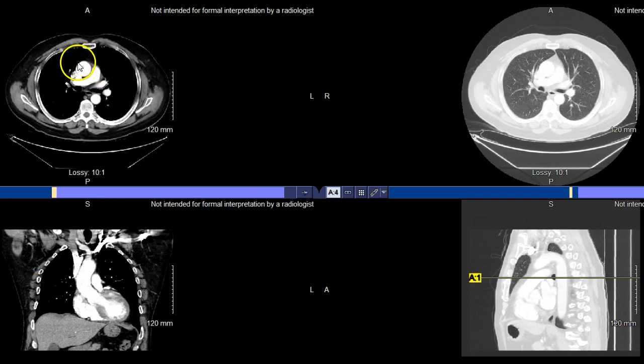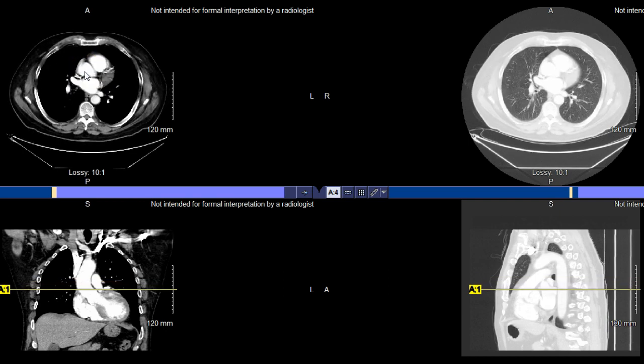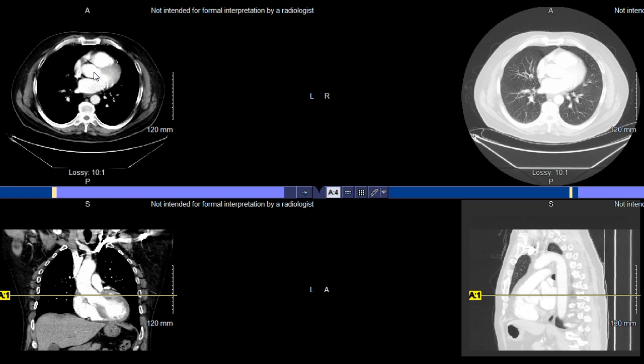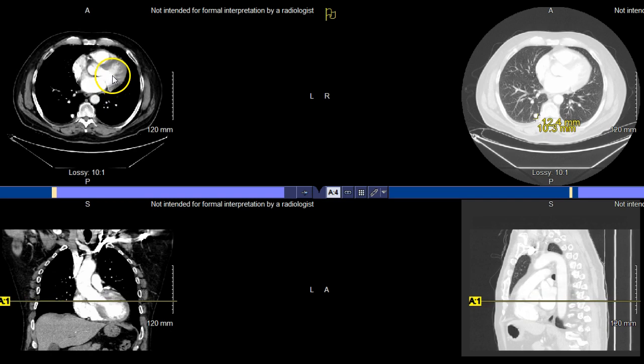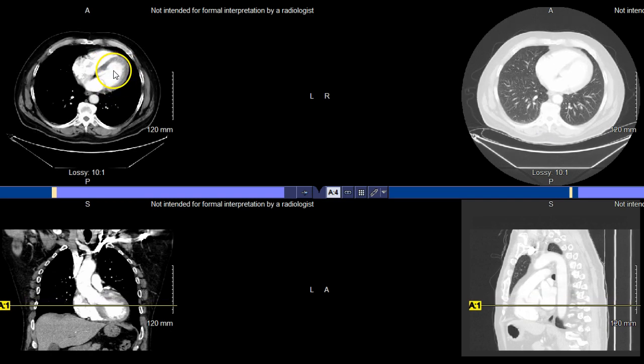The ascending aorta, it's kind of embedded right in the center of the heart as we move inferior. So you can see where that's located. So you kind of have the chambers feeding around that ascending aorta there, respectively. So really a true central structure. And then you can kind of see how it's dividing. The contrast is kind of bleeding into this section here. So what we have here then would be the left ventricle.